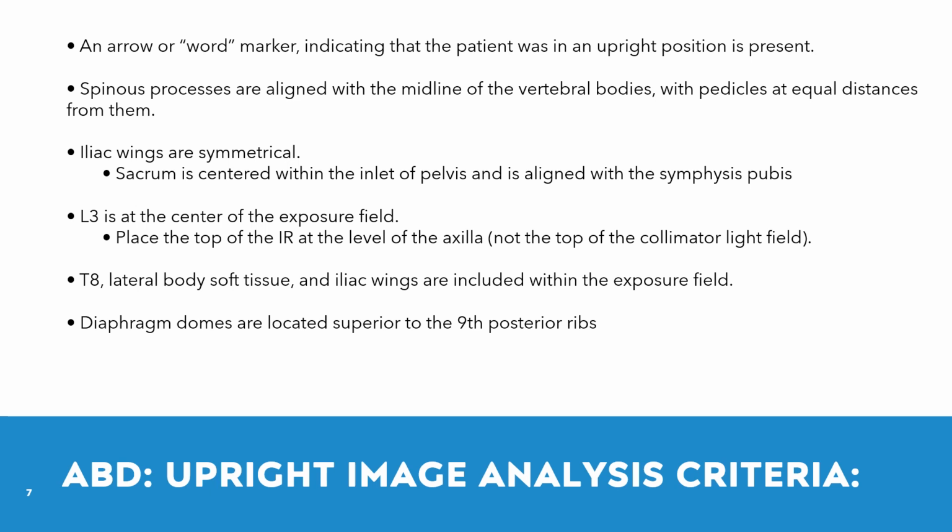T8, the lateral body soft tissue, and iliac wings are included within the exposure field. Diaphragm domes are located superior to the 9th posterior ribs, and the diaphragm should be visible on this view.